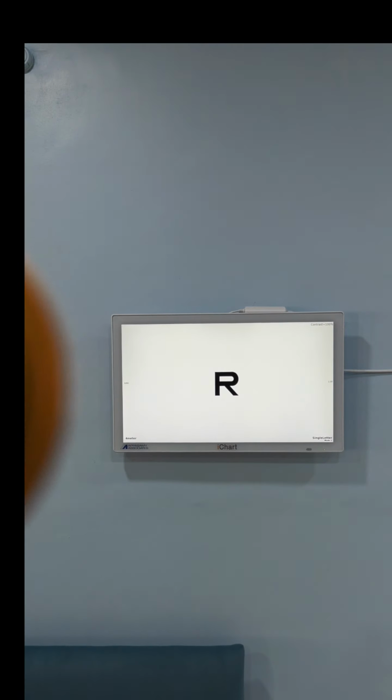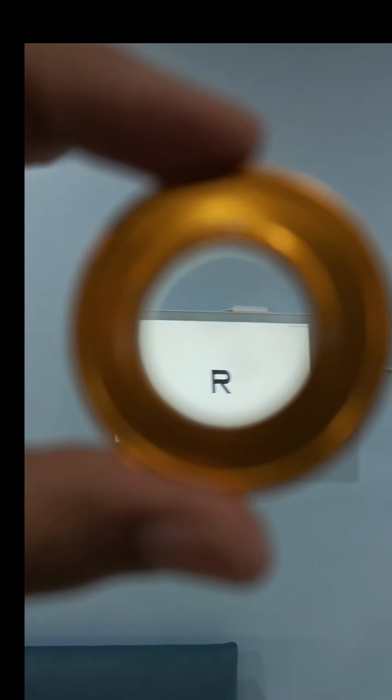For a cylindrical lens, the correction is provided in only one meridian. Hence, when you move the lens circumferentially, the image appears to be distorted. Important point to notice here is that the distortion of image changes as the lens is rotated. The maximum distortion occurs in the meridian perpendicular to the axis, and no distortion occurs along the axis.